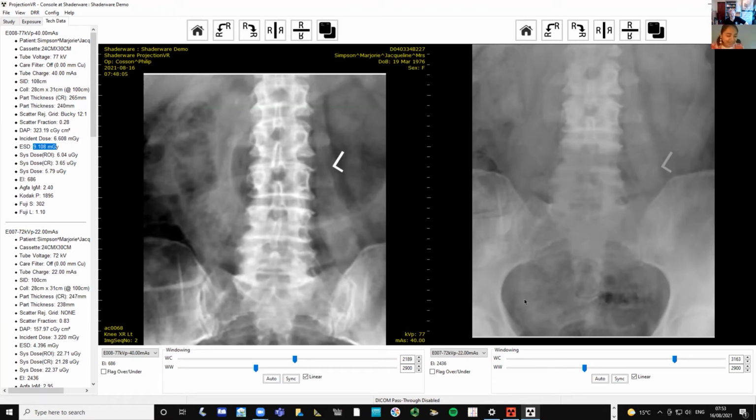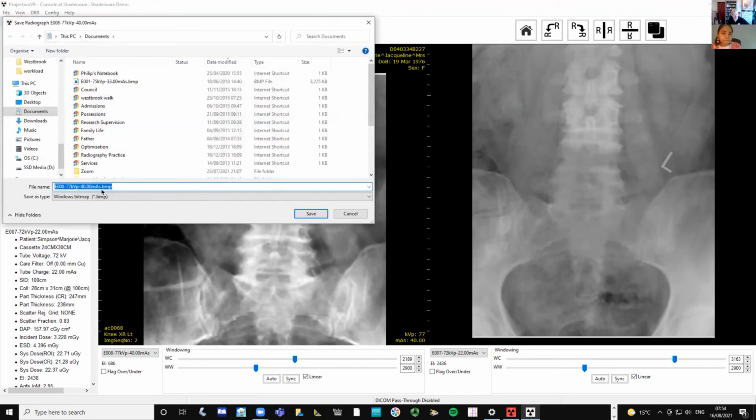Okay. For my next question, sorry, I have a list of questions. Will there be printables or downloadables? Like for this image, since the questions earlier, you already answered it. There is an image production, it was already clearly explained. Can the student download this? So if you see here, I can save the left image or the right image as a bitmap or a PNG or a JPEG anywhere I want.